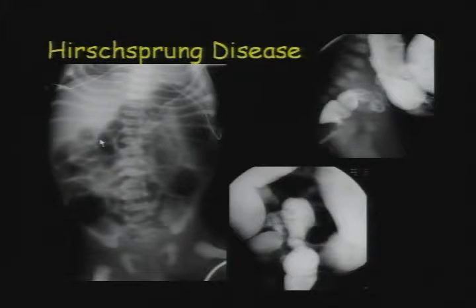Here again, you see a distal bowel obstruction, multiple dilated loops of bowel, and when you put contrast in the rectum, you can see a small caliber rectum with the sigmoid being larger. The rectum should always be bigger than the sigmoid. This is one of my three diseases, with malrotation being one. Hirschsprung's disease, from a making-the-diagnosis-using-radiology standpoint, to me gets harder the more cases that I see.